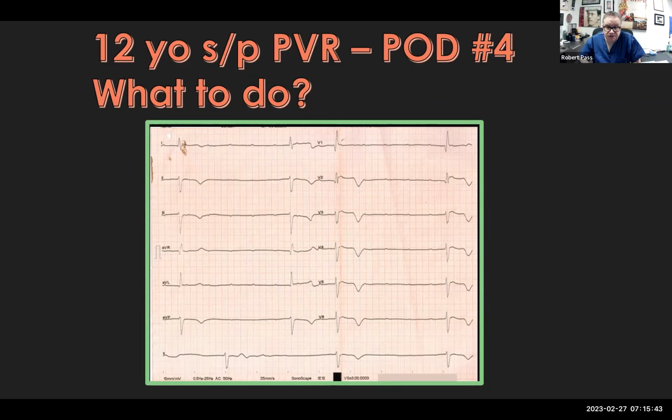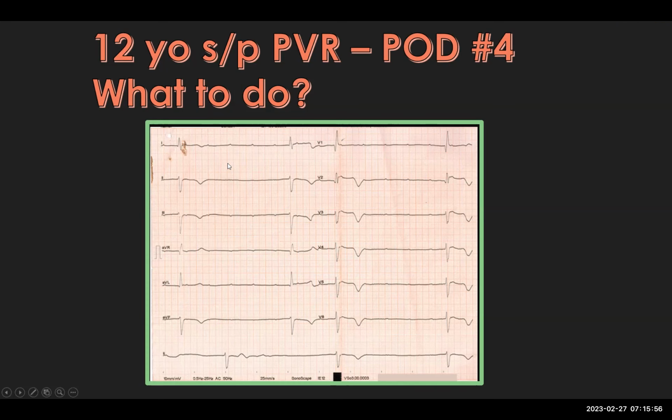Well, it's hard to tell, right? Because generally speaking, when people are in heart block, you see a pretty consistent R to R interval. However, you could argue that maybe the irregularity from this beat to this beat suggests some conduction, but it's also possible that this is just a ventricular escape beat of some sort, right?